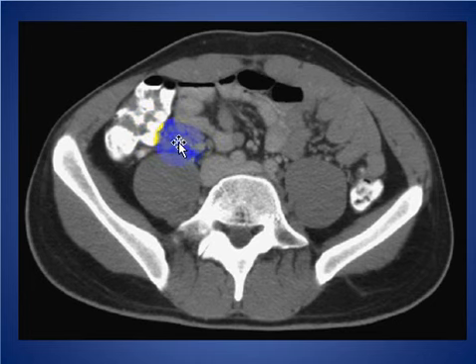There is nothing suggestive of tumor in the surrounding structures in this patient. So this multiple mesenteric lymphadenopathy with normal appendix and no inflammatory changes around the cecum is consistent with mesenteric adenitis.